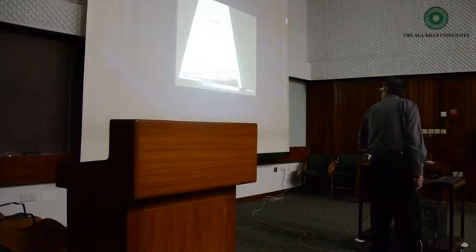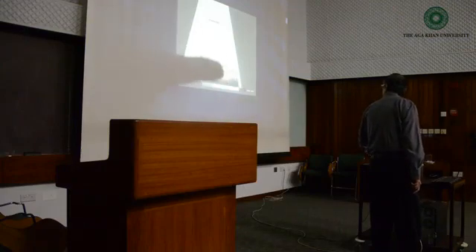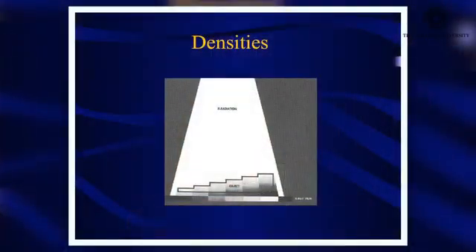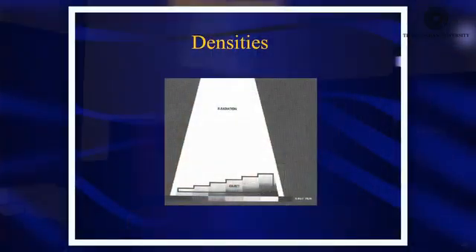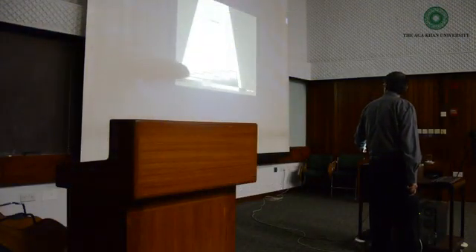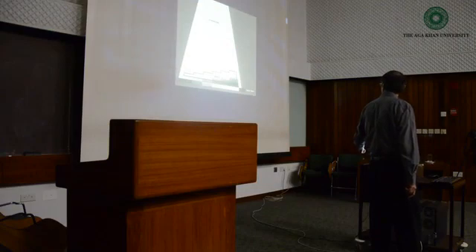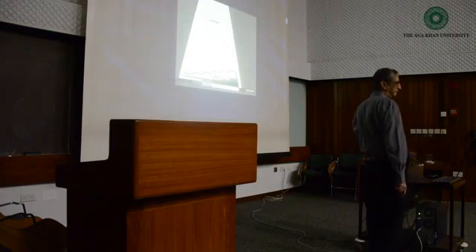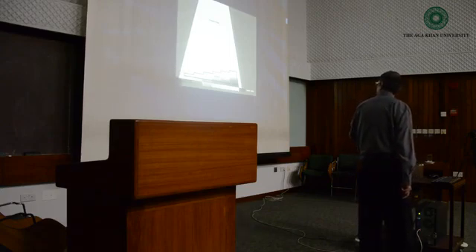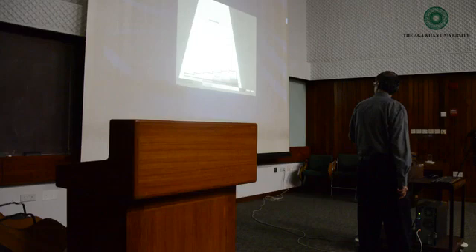Here, okay. So can you see the different densities as you increase? So this is very thick, isn't it the whitest here? And it's rather black here. A very thin attenuation of X-ray and it's quite lucent or black at this end. Understood? Okay. I think finger is too big, so a pen would be better.